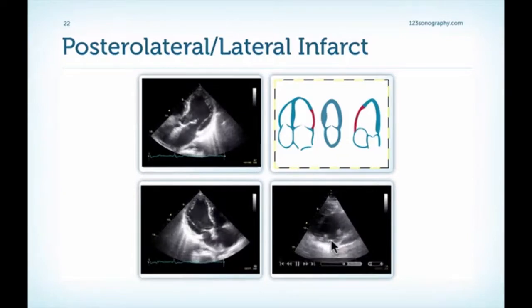You see this very nicely often in short axis views, as I mentioned previously. So you see the infarct extending here into this region here. So this is the posterolateral lateral wall.